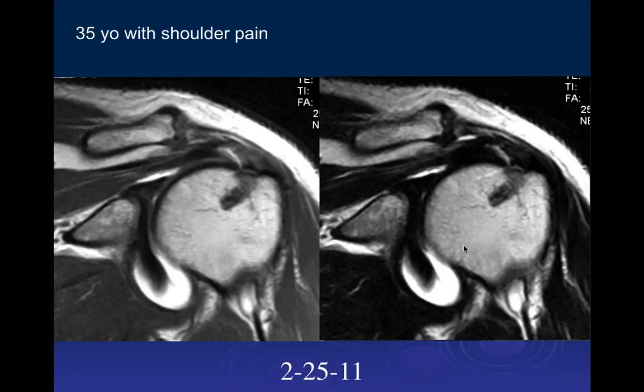Okay, so we've got a 35-year-old with shoulder pain. Got coronal images. It looks like we've got a repair anchor. Now, we do have another hypointense linear structure kind of drooping down into the glenohumeral joint space. Yes, that's going to be the labrum there. Good. Kind of some fluid throughout, which could be expected. So you've got a little bit of fluid going into the tendon here.